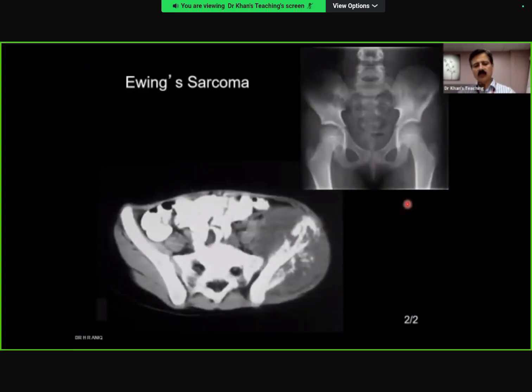And this was a Ewing's. If you read literature, the literature will tell you that sometimes it's very difficult in Ewing's, or you can confuse an osseous matrix. You remember we were discussing osseous matrix in the previous chapter, and you can have a discussion in your mind, oh, is there osseous matrix? So the literature tells you that at times in Ewing's, the periosteal reaction is so exuberant that you can confuse it, and it will give you a bit of sclerosis like this.